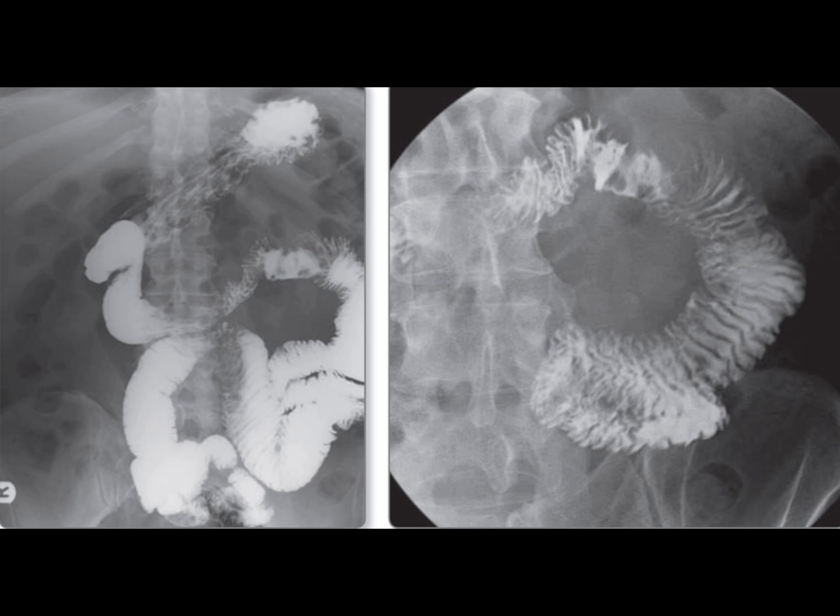If the patient has a history of inflammatory bowel disease, this lesion could represent a segment of Crohn's disease. However, I don't see any stricturing or obvious ulceration here. For patients with a history of celiac disease, especially if dietary control is poor, I would consider lymphoma, a recognized complication. Notably, the mucosal fold pattern in the duodenum and jejunum appears to be normal otherwise.